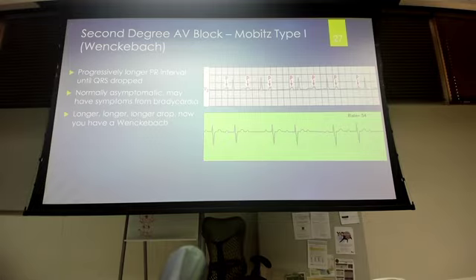But guess what happened again? This looks normal, prolonged, and then we got a P wave without a QRS. So when we're looking at that rhythm, you've got to make sure that QRSs are after the Ps and the Ps are before the QRS. That's the reason why. If we have an AV block, you'll have Ps without QRS complexes, where the atria are depolarizing just fine, the issue is at the AV node area. Something is causing a block and will not allow that depolarization to get down to the ventricles.